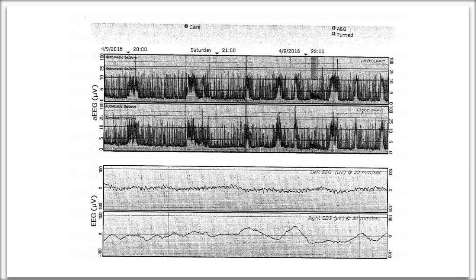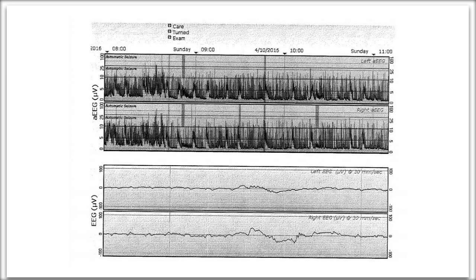I would have liked to see some of these areas in a little more detail, but I think this baby warrants a full EEG and a more detailed assessment. I wouldn't necessarily load or treat based on this, but it does make me very suspicious. The difficulty in the NICU is with so much artifact, and without video, it's very hard to say what's going on. But now we're on the next day, April 10th at 9 a.m., and we see these disruptions persisting repetitively and make me very suspicious of seizures without seeing each of them individually.